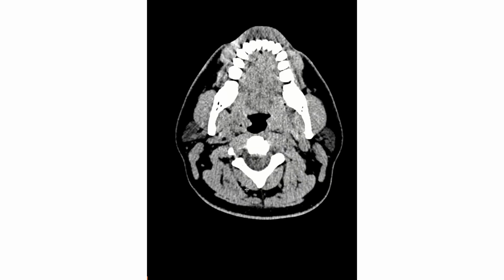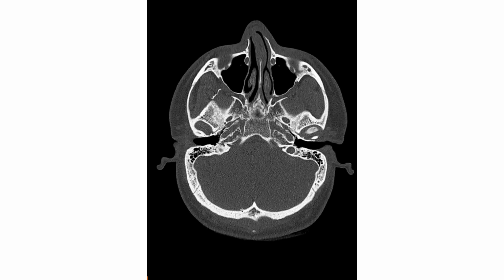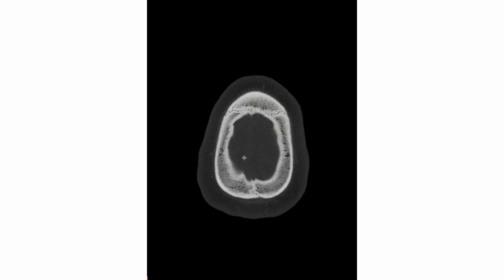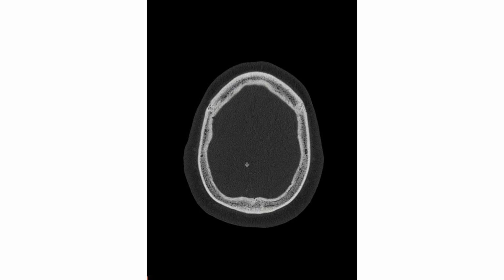Okay, so when I finish this, then the next thing I would like to look at is the bone window. As you see in the bone window, if the patient is coming with trauma, we are looking for fracture, and then we have to be able to differentiate fractures from these sutures that you see. Sutures have this zigzag or a very harsh appearance compared to the fracture, which is linear and well-defined and not in the expected area of sutures. Sometimes it's not very easy to differentiate these two, specifically in small cases. We have to just use our 3D reconstruction to make sure we are not missing any fracture.